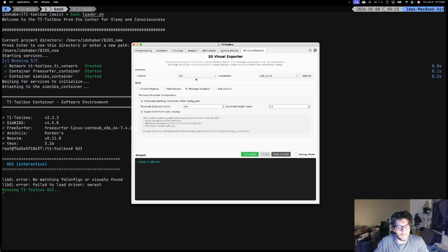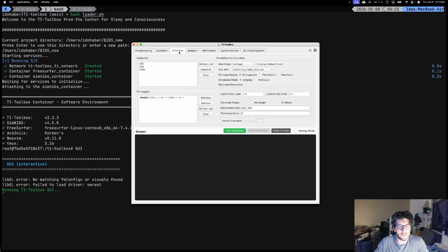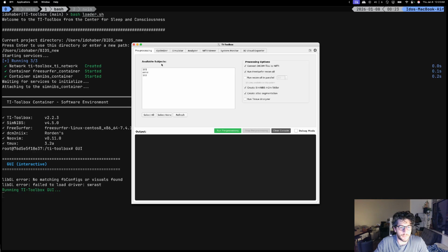And I will change to Ernie. This is a nice simulation, and in order to be able to do this, one has to have a simulation output. So if you don't have one, please do it. Pre-process some DICOMs or use the default subject we ship with the toolbox, which is Ernie.